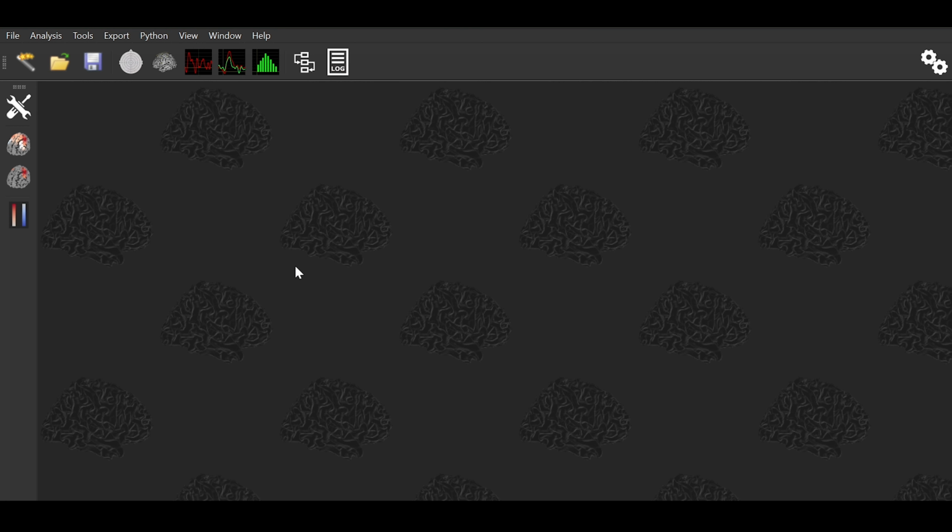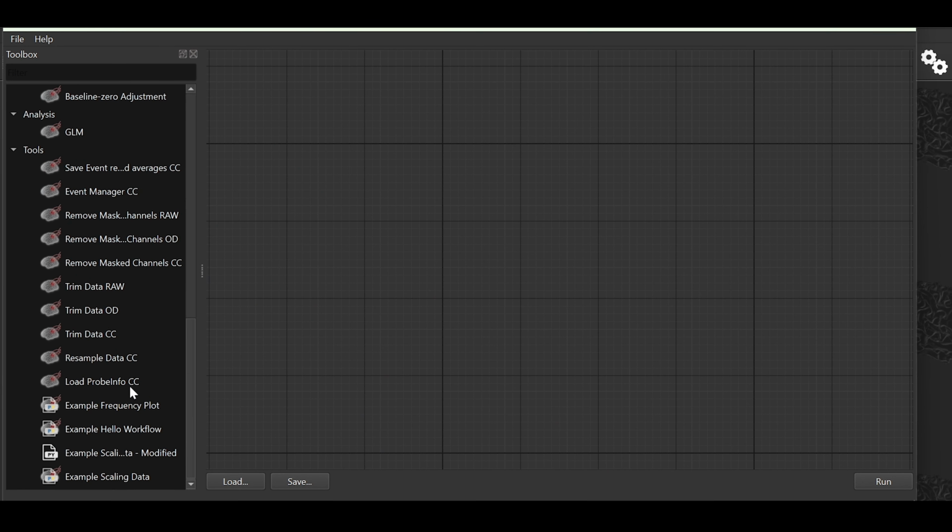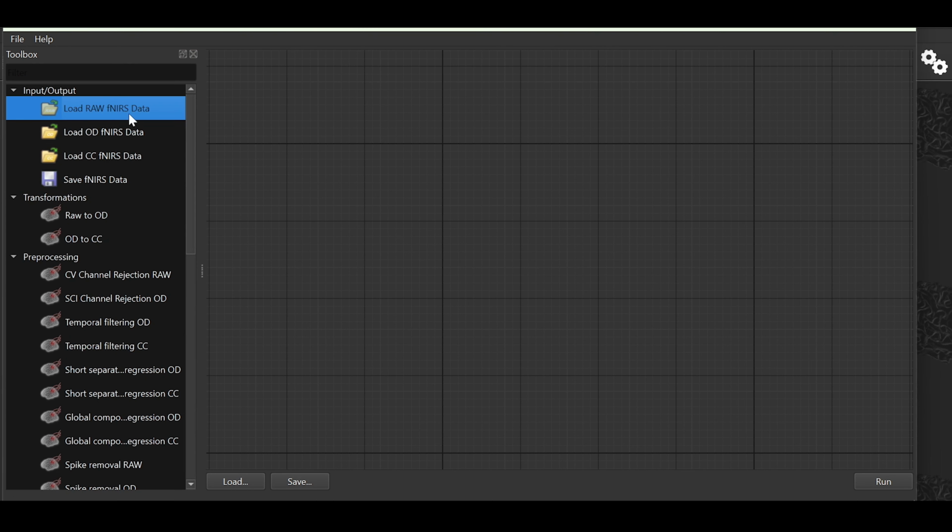Python-based solutions means that code can be run to manipulate, transform, or display data in new ways within Satori. These functions can be accessed by both the drop-down menu and directly from the Workflow Manager as Python-based workflow modules. Let's look at an example in the Workflow Manager with the inbuilt frequency plot script. Customized plots like this one may be useful to execute at any time during data evaluation or pre-processing.